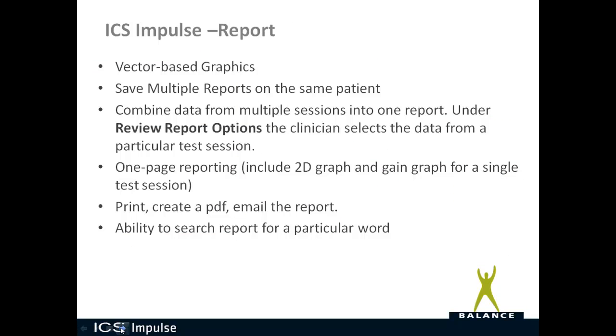So first thing, let's talk about the report. The report has vector-based graphics. These are the quality of graphics that can be submitted to peer-reviewed journals if you're doing research. You can also save multiple reports on the same patient. You can combine data from multiple test sessions into one report under Review Report Options.